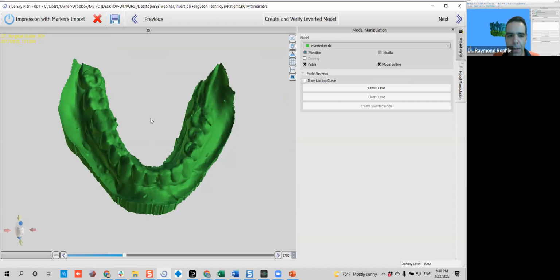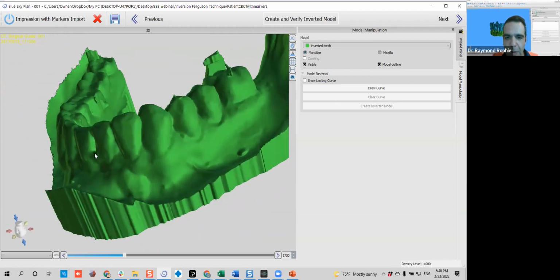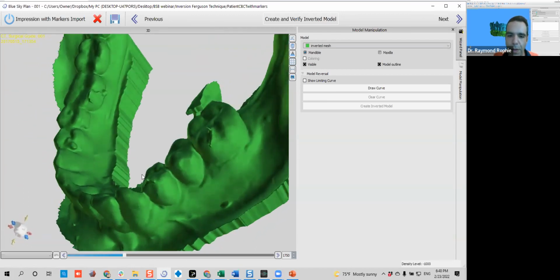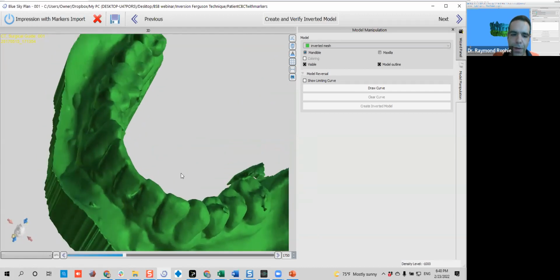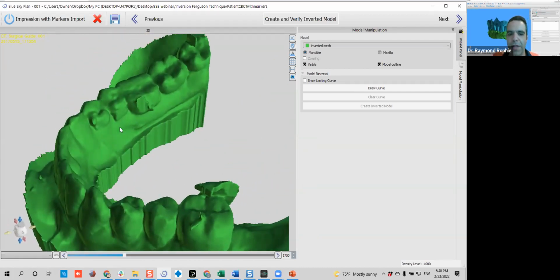Okay. As you can see here, it might look somewhat fuzzy. However, it doesn't have errors of soft tissues overlapping, etc. I will be more than happy to later show some errors. That will be another good webinar, by the way. Some errors and tips and tricks and how to get the data acquisition.